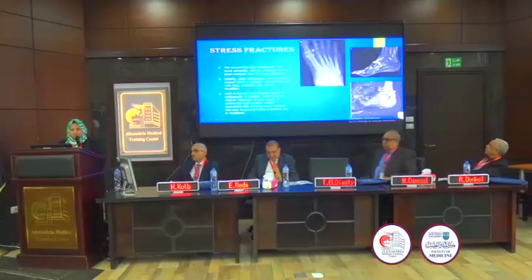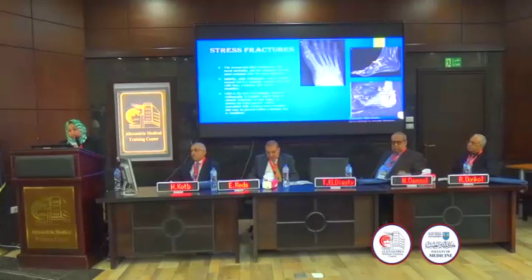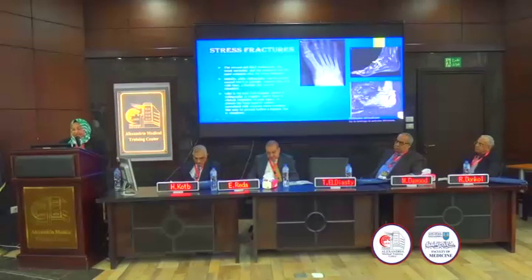Stress fractures in general in the foot, of course, are common in the metatarsals, but if we talk about the hindfoot and midfoot, stress fractures are common in the calcaneus and navicular bones. And of course, the initial stage of examination will be the plain X-ray, which can be entirely normal at first. But with time, a fracture line can be identified, either a frank fracture line or a subtle fracture line.